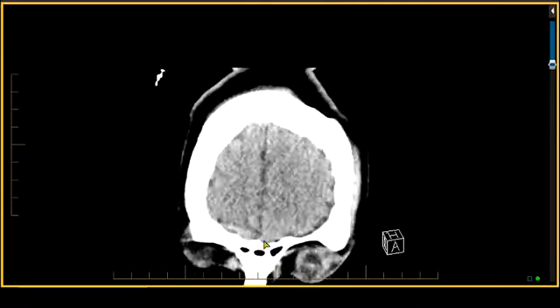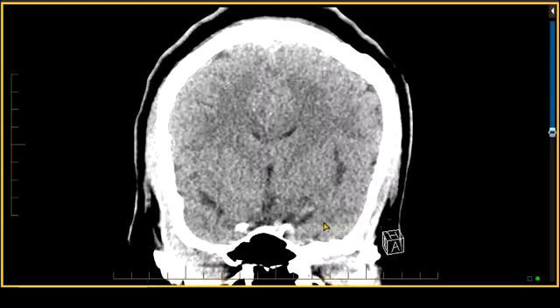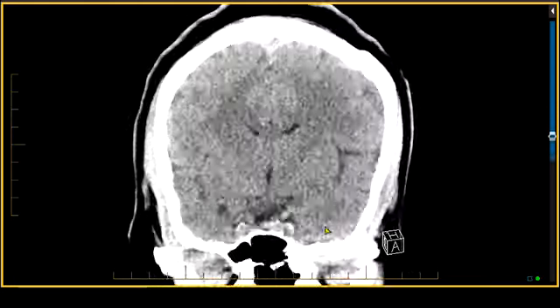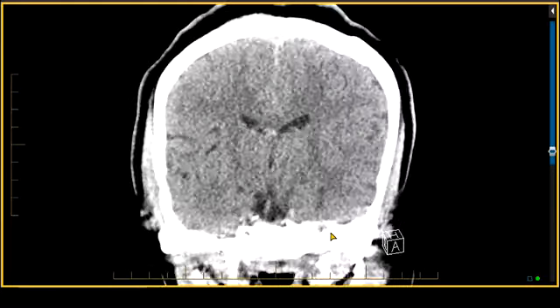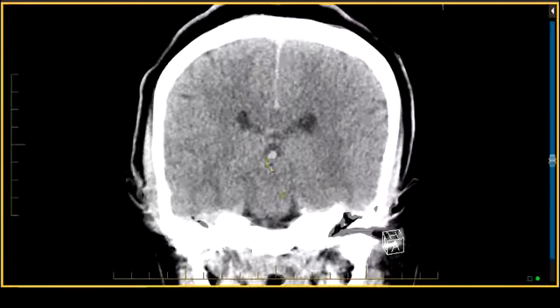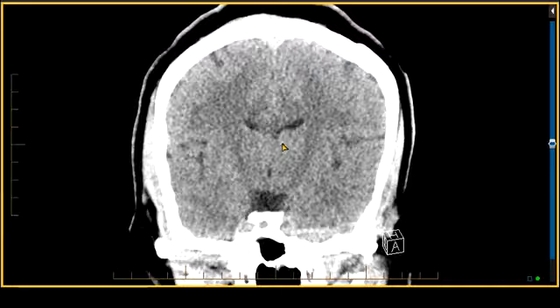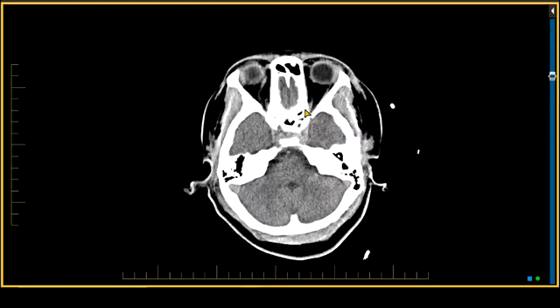Coronal scans would be helpful to look in the gyrus rectus region for hemorrhage or contusion, as well as the anterior temporal lobes. And we wonder about a collection here along the floor of the middle cranial fossa on the left side. We see some of that blood products adjacent to the lateral ventricles. The patient was not doing well and got scanned 6 hours later as part of the protocol.